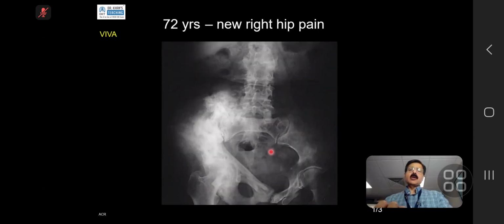Excellent. Well done. Now, if you see here, this deformity, etc., is all explainable because of the chronic Paget's disease. On this X-ray, the key finding is here. This is the SI joint, this is the upper portion of the sacrum, the iliac bone. Compare this versus this. There is osseous tissue here, which is abnormal osseous tissue.